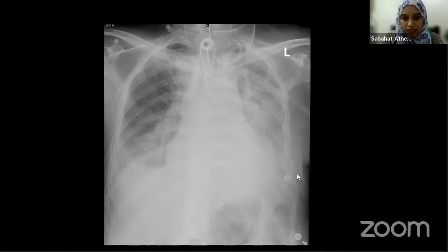You saw this case, what do you do? NG tube in the left lower bronchus. Once you see this finding in the exams, do not wait for the examiner to ask you what to do next. You say, I can see that the NG tube is in the lower lobe bronchus, and I would make an urgent call to the ICU. Exactly. Okay, let's go to the next case.